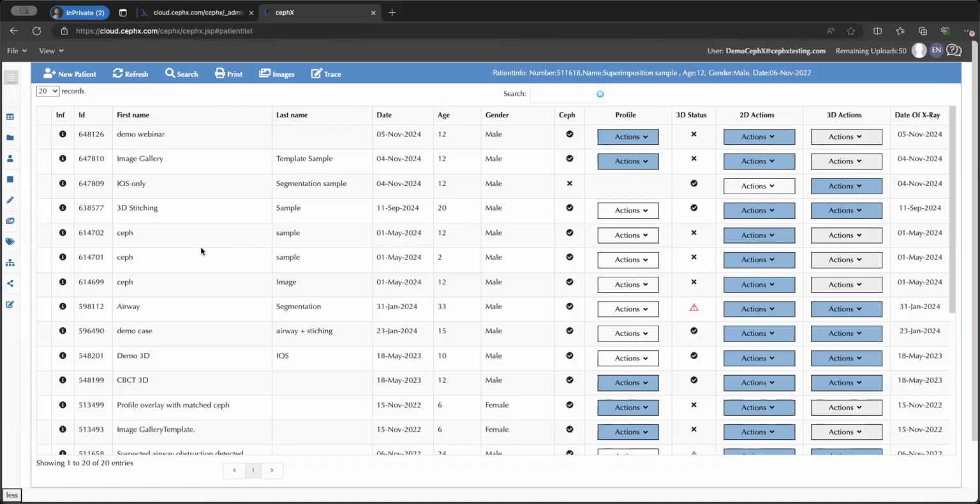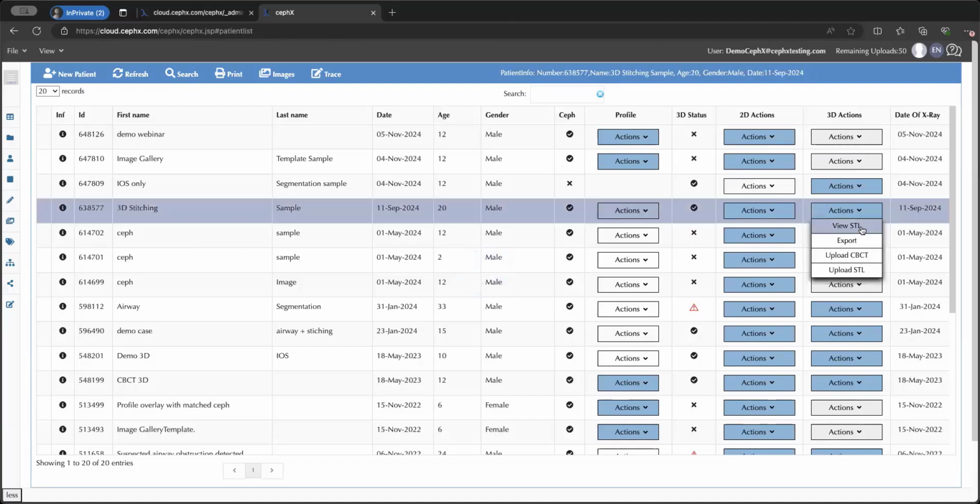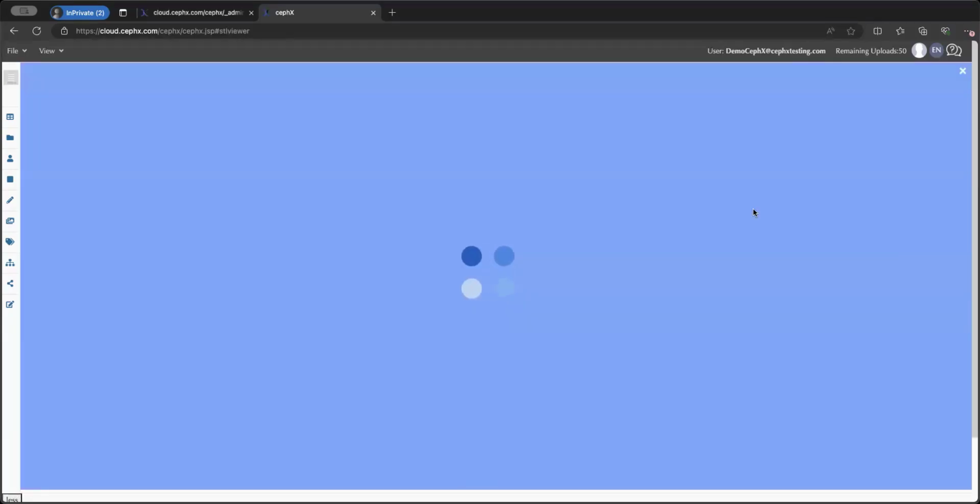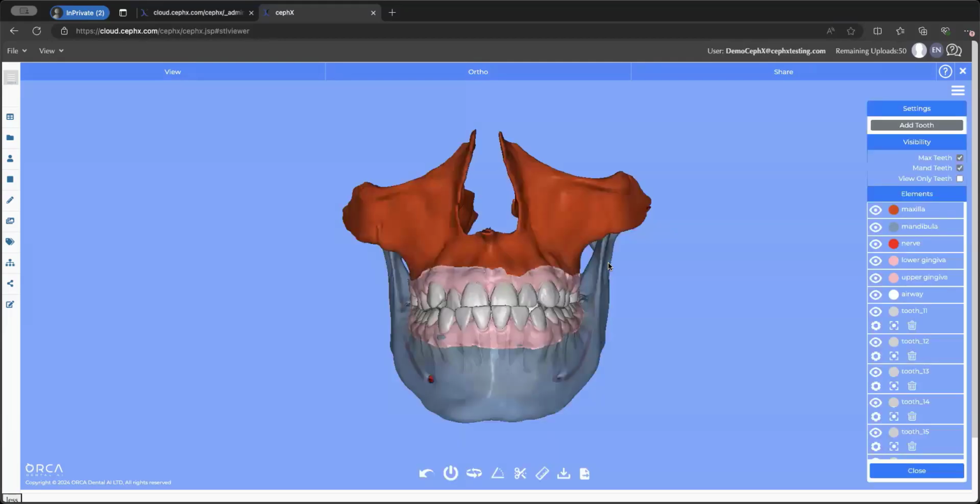The best way to show it is to go into the segmentation. Okay. So this was a DICOM that was uploaded. Yeah, wow. Taking time with the internet. Again, depending on the connection speed, it can load within basically 2 seconds, or it can embarrass me and take a little longer, but it really depends on your internet connection.